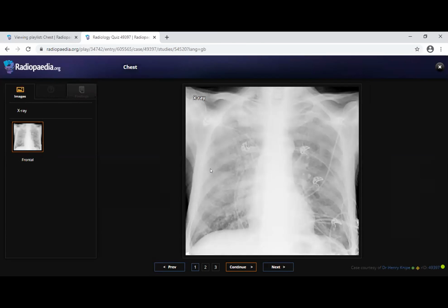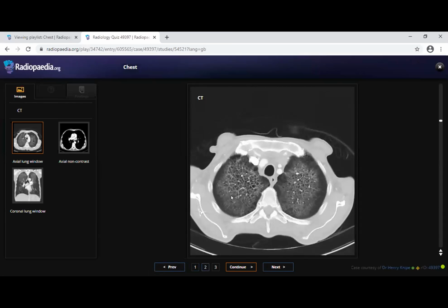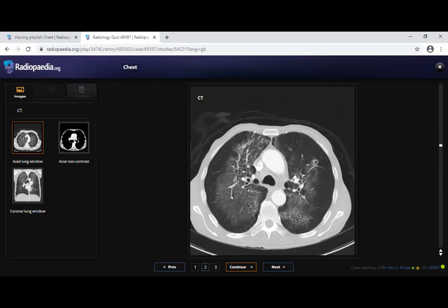This was a case of PCP. This is a non-specific finding in the radiograph, and you elicited the history of HIV positive. So in that case, the primary diagnosis becomes PCP pneumonia. Here you have the typical findings with the perihilar opacity and thin-walled cysts.